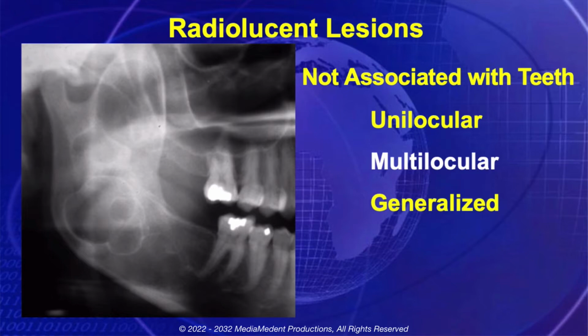Pathosis that presents with a multilocular radiolucent appearance may be found in the maxilla, but is more common to the mandible. The true multilocular radiolucency contains two or more pathologic chambers partially separated by septa of bone. These septa may be relatively wide and radiographically distinct, or thin and indistinct, causing the lesion to appear more unilocular. The terms soap bubble, honeycomb, and tennis racket have been used to describe the various pictures of multilocular radiolucencies.